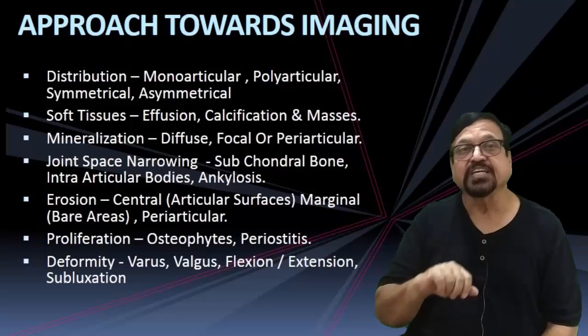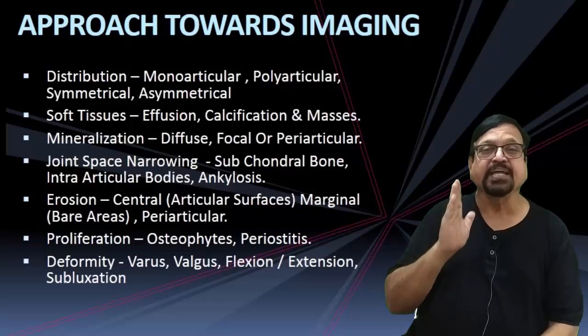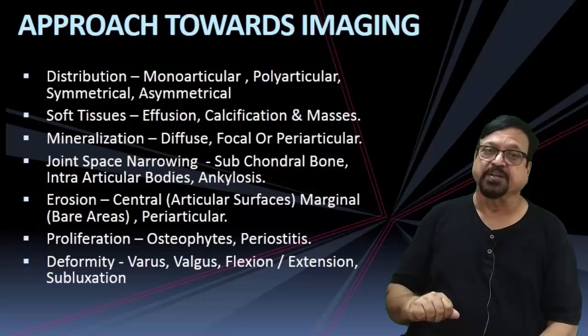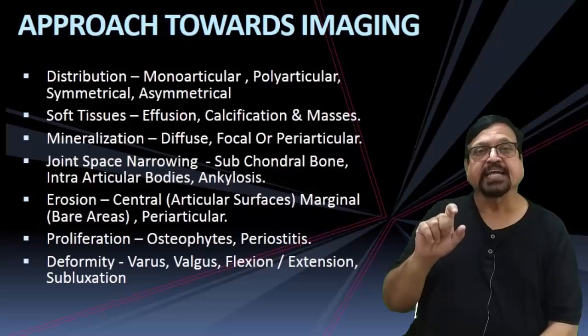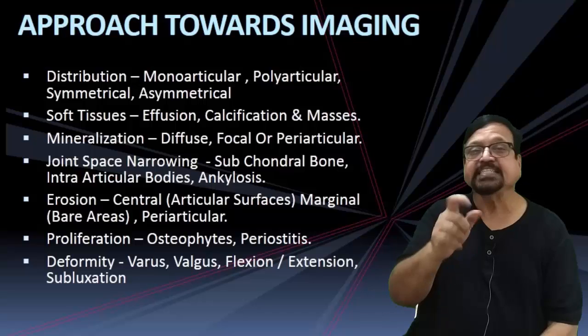Now, erosions. One has to check erosions very carefully. Where the erosion occurs is very important. Like, you can get it on the weight-bearing surface, you can get it at the periphery, you can get it at the center.